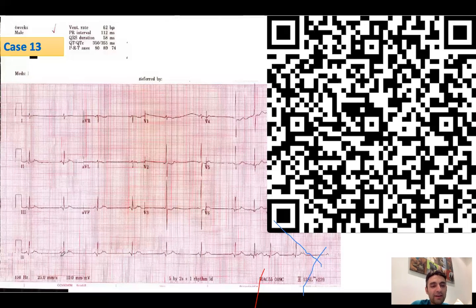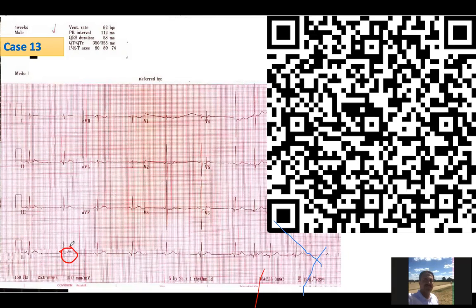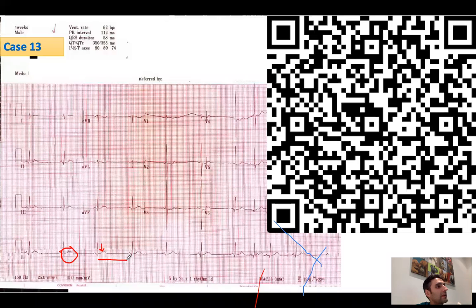Of course PQRS, funny T wave, right? Yes. Okay, there is a sharp deflection in the T wave. Bradycardia. What do you think of when you see this? What comes to mind?